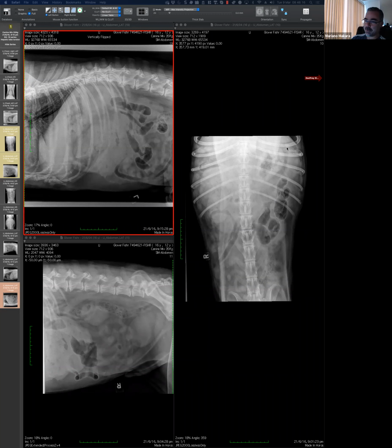Because even if you see the spleen here, that's the dorsal part. That's the left dorsal part of the spleen. And this is on the right. So it could be in the tail. Splenic mass. Yeah, absolutely. I would never remove that from the list of possibilities.